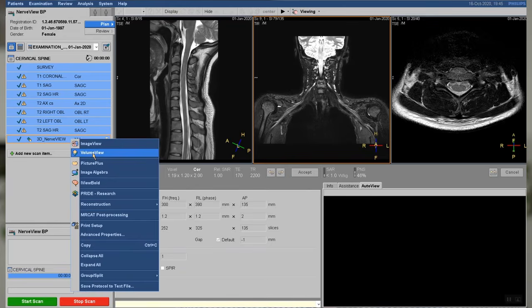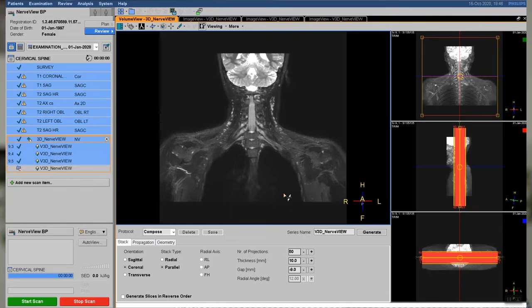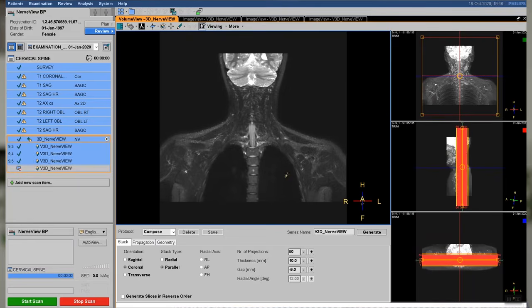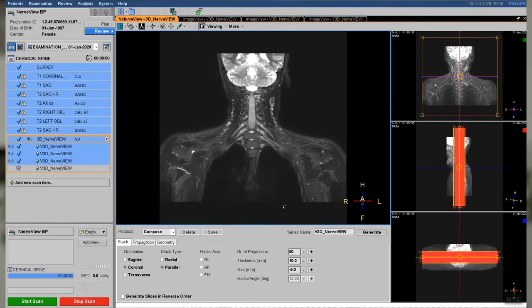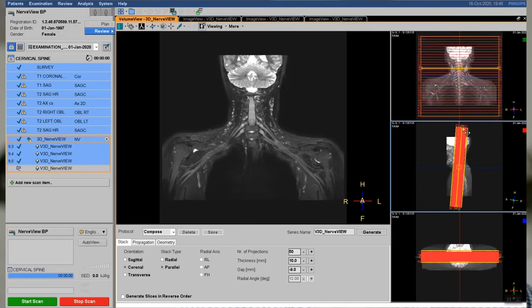in the nerves. The other thing is the patient is breathing, and we can't stop that for scans as many times as we'd like to temporarily. But just breathing motion itself, and depending on what body type you have, that can be much worse in some than others. So 3D NerveView is, from the basic construction, a 3D STIR, but it has prep pulses called MSDE pulses, which suppress the blood flow through these nerves to really make the nerves stand out without artifacts around them.